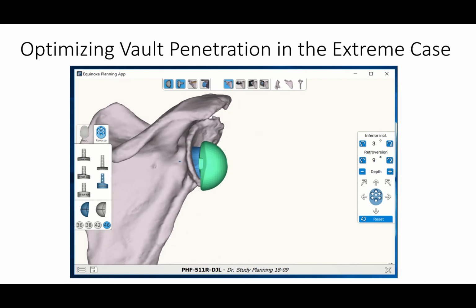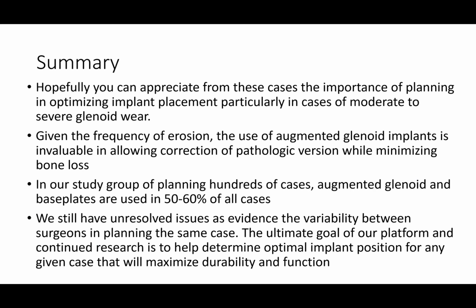And I would argue that there's no way that that could be achieved simply by eyeballing it. So again, in these extreme cases, this technology is extremely valuable in both the planning and the navigation phase.